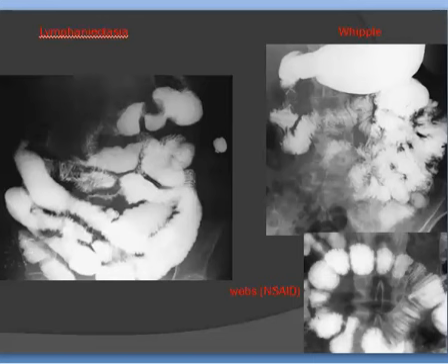We have a lot of things, giving coarse intestinal mucosa, coarse intestinal mucosa. Loculated contrast along the small intestine from prolonged use of drugs.